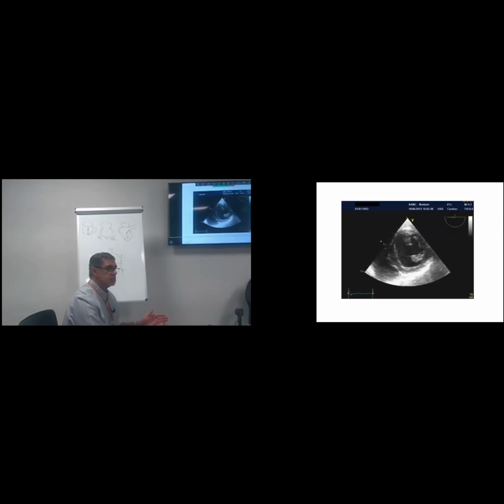How to confirm? Somebody uploaded a video of a short axis view in the previous week and started to comment on hypokinesia here and there. He made two mistakes.